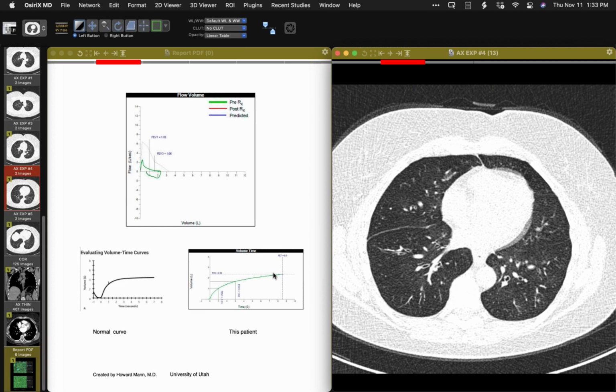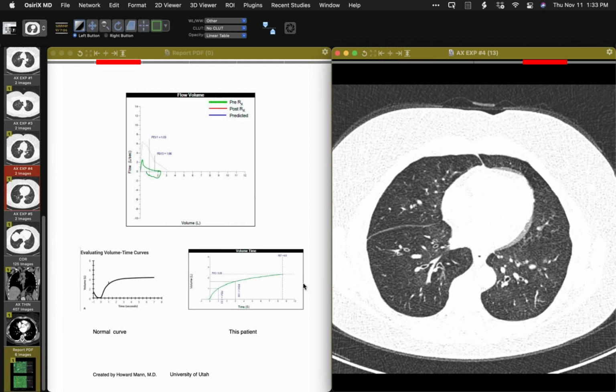But Howard, yep. I would make the point that the vascular abnormality in your case here is pretty profound in that right lower lobe. There just aren't any vessels out there at the periphery. Using symmetry, as you pointed out before, there's a paucity of vessels out there.